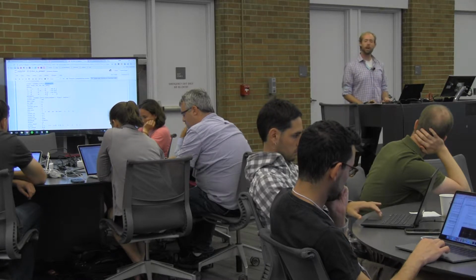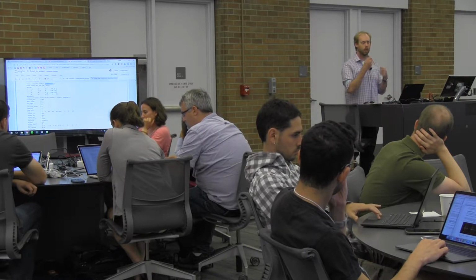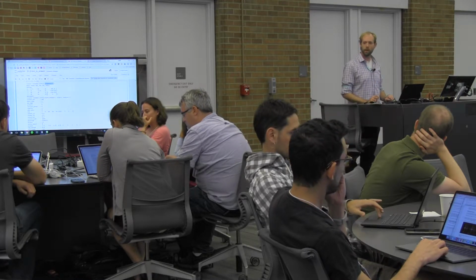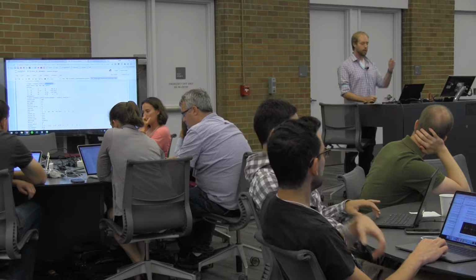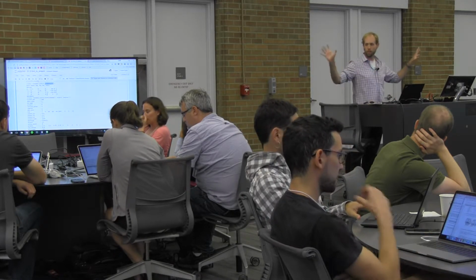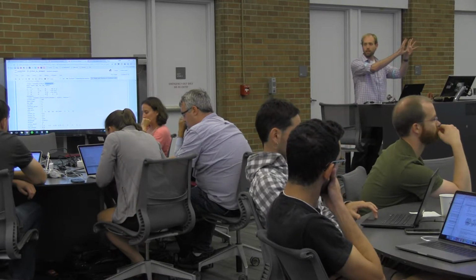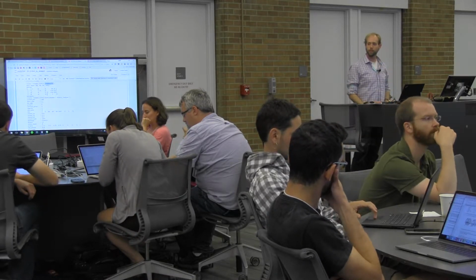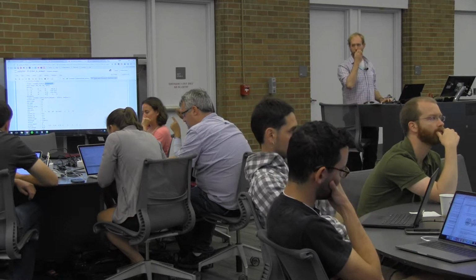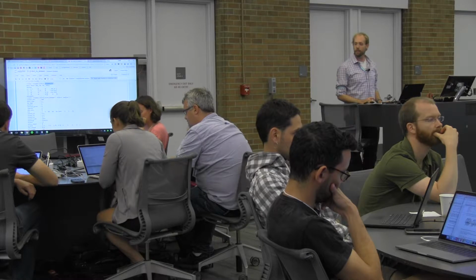Yeah, I'm not sure how. It may try to be clever with being efficient with memory, but my guess is that what it's doing is just pulling out data from the Nifti data and copying it and giving you back a 2D array. So it's not changing any of the data inside the Nifti object. It probably also does the reverse, just through the masks. Where there's one, then just copy it.